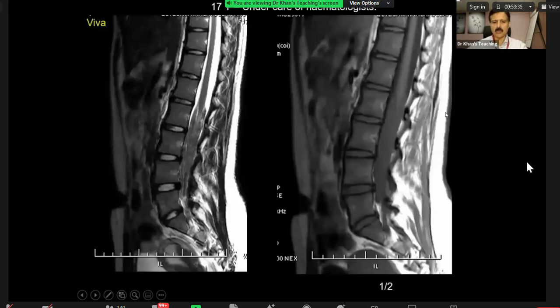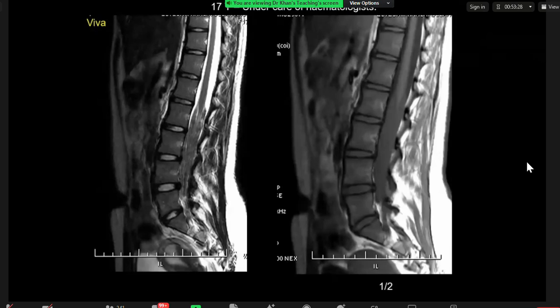So look at this case. This is the last case. Over to you. So 17-year-old under the care of hematologist, I can see there's abnormality at the Cauda equina roots. On the T2 images, I can see there's a thickening of the Cauda equina roots. Under the care of hematologist makes me think that the patient could have an underlying hematologic disorder and result in siderosis.